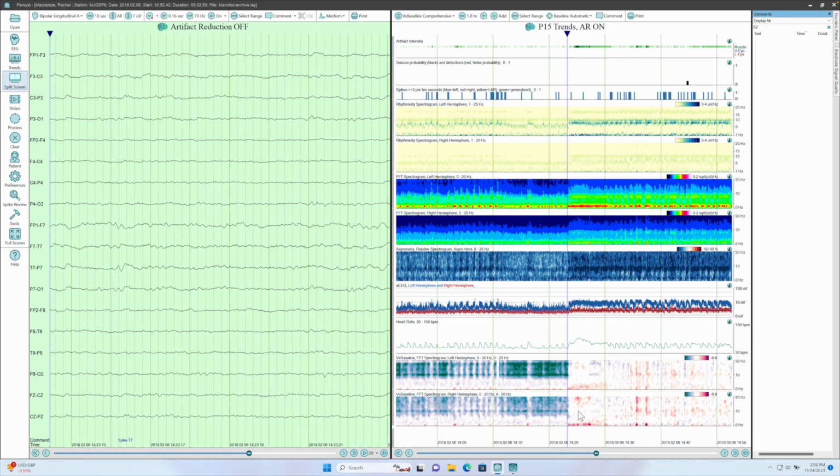After the mannitol, it was 15 minutes later, around 14:40, that they felt the patient had somewhat improved clinically, but the EEG improved immediately after the dose of mannitol. The patient's EEG returned to the post-stroke baseline immediately after receiving mannitol.